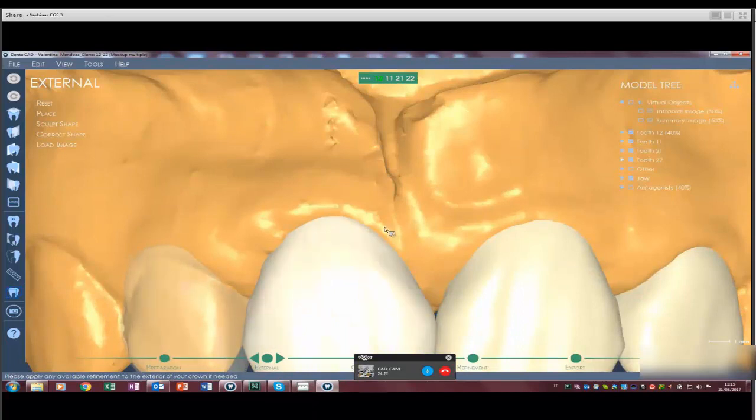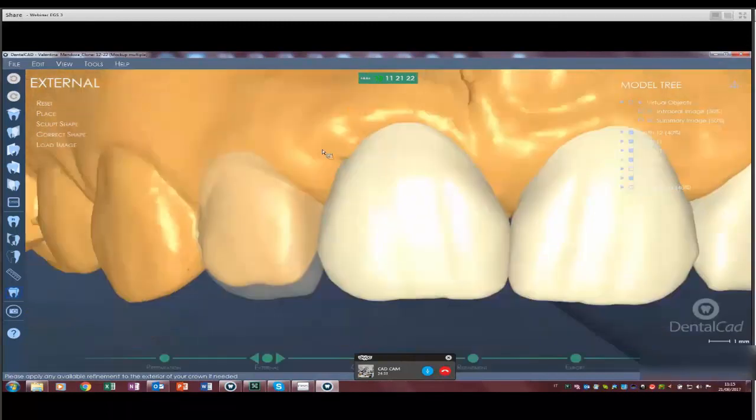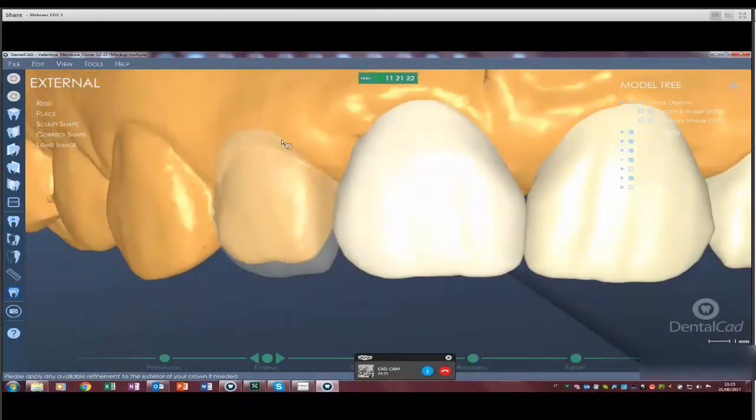Okay. And then there is something more that we can do. For example, we can print this kind of mock-up to help the soft tissue to recover after the extraction, because we will press it and push the composite material inside the mock-up onto the soft tissue to help it recover in a much faster and much safer way. Okay, and this is one advantage.